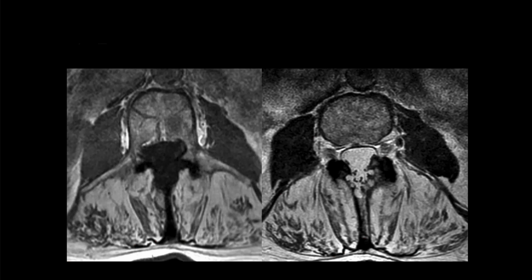Okay, Robert. All right, so here it looks like there's some dural ectasia, some scalloping of the posterior spinous process there. Good. And then the other thing that we see here is marked atrophy of the spinal erector muscles. Why do you think that may be the case? Maybe they've had surgery, or I'm not entirely sure. Well, they have fusion of all the joints in the spine.